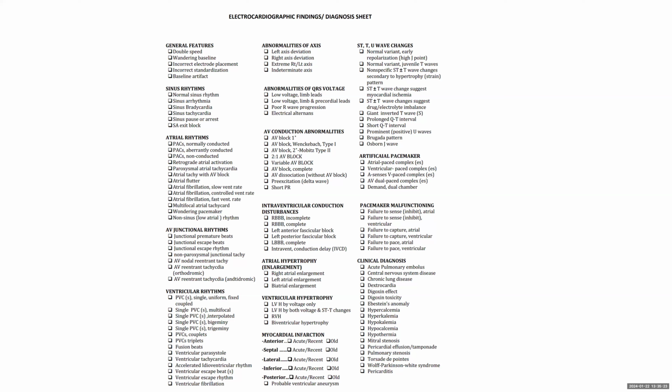Yes, it's expected, but you still, I think, just like the idea of left axis deviation and left anterior fascicular block, you can code both and you'll be correct. I don't think we have injury. Yeah, that's the American one. The American codes have injury and ischemia and all that stuff. Here you don't have it, which is better. Good.